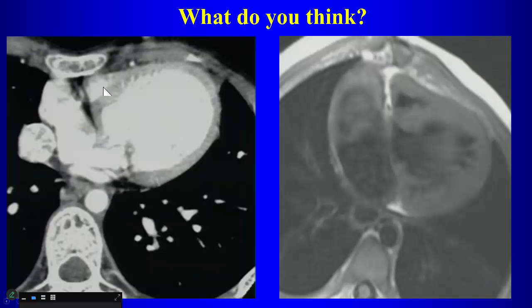Well, this guy here is the mitral valve. There is no tricuspid valve, right? Tricuspid atresia. So there's no communication from the right atrium to the right ventricle. That's why the right ventricle is small. If there's decreased blood flow through a vessel or a chamber in embryology, that chamber will not develop. That will be small. So there's fat where the tricuspid valve should be.